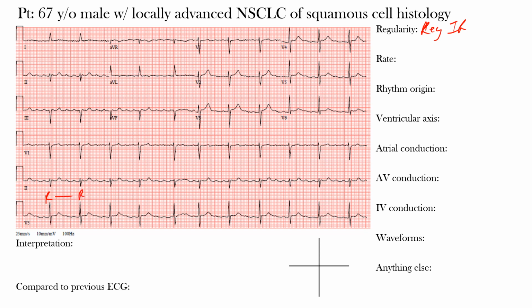And what I was saying here is that the R to R interval from this to this, from one R wave to the next, you could see that it's the same through here. From this R to R interval is the same as the following one, and then the one that comes after it is also the same. And then you'll notice that this distance from this R wave to this R wave is actually a little longer, so it's not the same as those that precede it. However, that R wave that comes after it, if you were to measure this out from this R wave until this one, you would see that's 2 R to R intervals. So it's almost like compensated for. It's where we would expect the beat to fall.